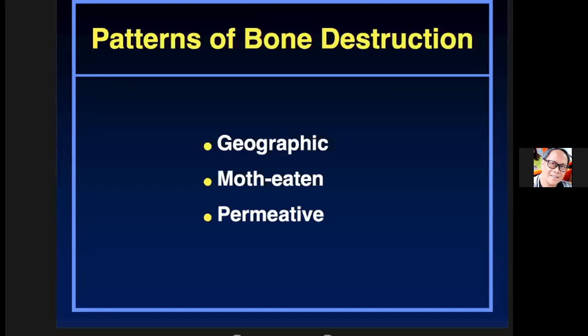There are other clues that we'll be discussing along the way, for example whether the lesion is confined to the bone, whether there is soft tissue extension, or the presence of matrix calcifications, meaning whether the center of the lesion shows calcifications or none at all.